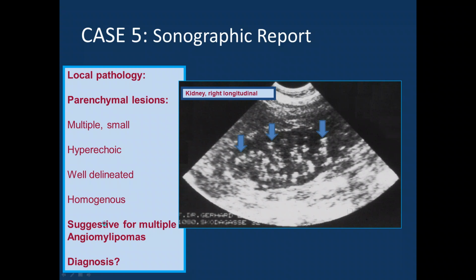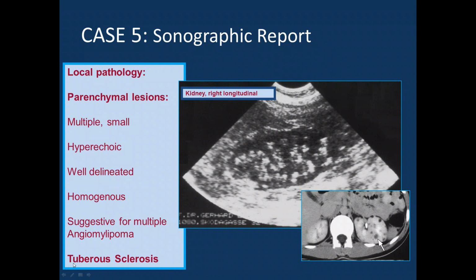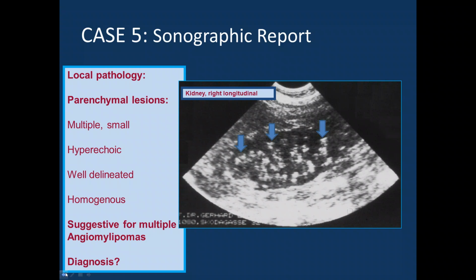And asking you what this could be, well, sometimes things go wrong. These are multiple round lesions and they are suggestive of angiomyolipomas. I just advanced and gave you the hint for the disease, and I'm not unhappy with that because we have to move on for the time. This is the classical appearance of tuberous sclerosis, which is a phakomatosis, and these are multiple angiomyolipomas.